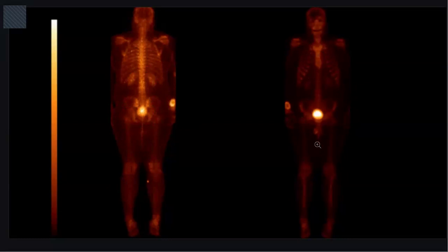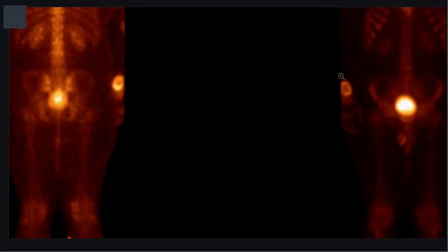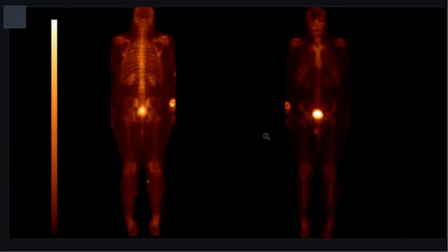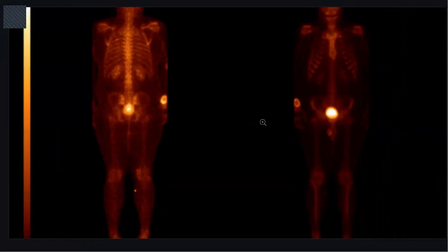We can see the kidneys, so it is not a super scan. Okay, all the spine and everything show uptake, except this area in the right forearm, and it doesn't show uniform uptake. It shows increased peripheral uptake and decreased central uptake, giving the appearance of a donut sign. Donut sign at this region, and this large lesion is not likely to be an osteochondroma. Osteochondroma is a small lesion, and it is not the typical location.